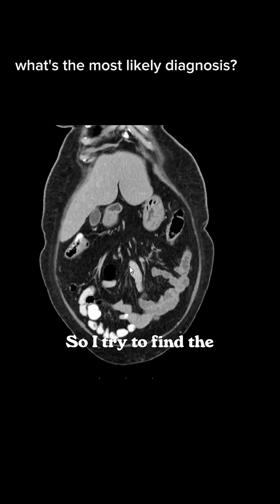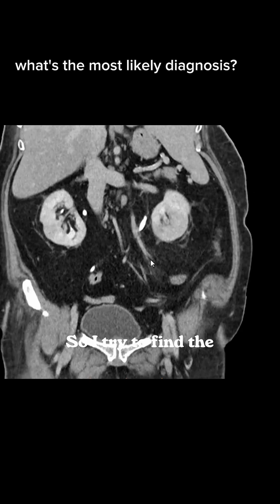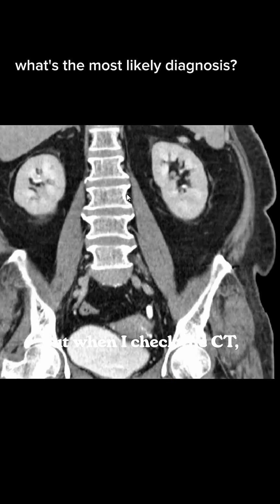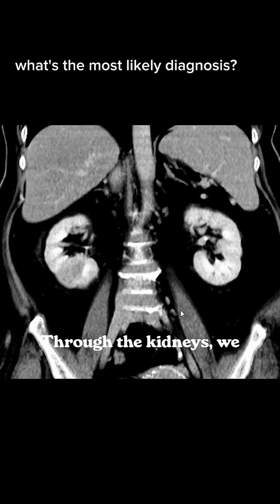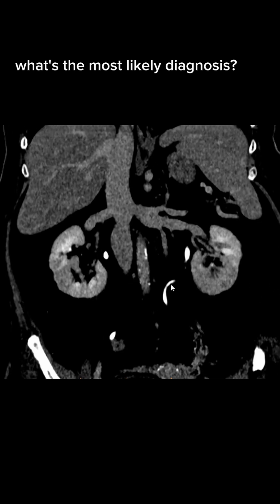So I try to find the explanation for why this patient has unknown fever, which is difficult to question. But when I check the CT, I find something maybe important to check as a good checklist, that through the kidneys we have to check for all the parenchymal changes. And if you agree with me, I will show you now.